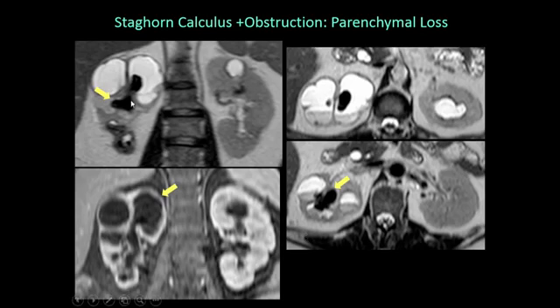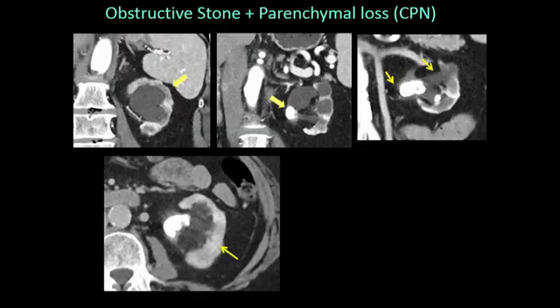You'll see a patient has extensive struvite stones. There's atrophy to the collecting system, really not functional in the upper pole. And this is a big problem for urologists. Either they have to go segmentally to remove it, or they sit there and do lithotripsy 4, 5, 6 times to this kidney to remove it. And they have to answer, is this kidney worth it to do all this type of procedures? Is the atrophy too much that they just need to resect?